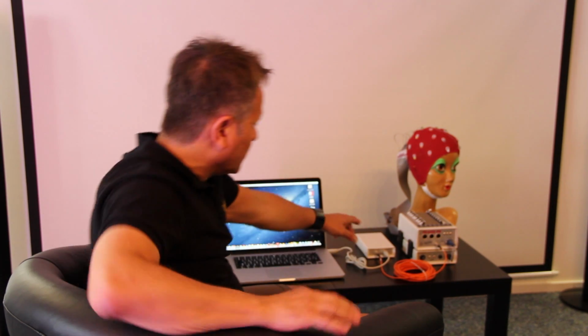And I will show you how to install it and how to run it, but with this small introduction I'm just making sure you understand that I'm running here a MacBook Pro Retina with 2880 pixels times 1800 pixels, and it will fill the screen absolutely perfectly. It will look super sharp and nice, and anybody out there using a Mac these days can do so with the latest ActiView software that also embeds the USB driver. So there's no need for installation of a USB driver.